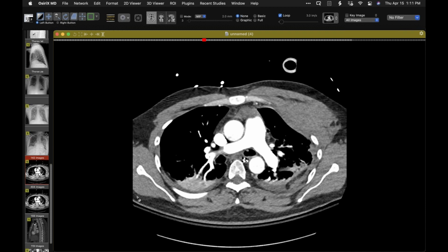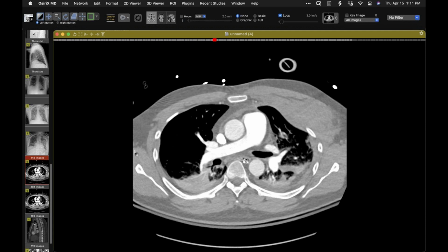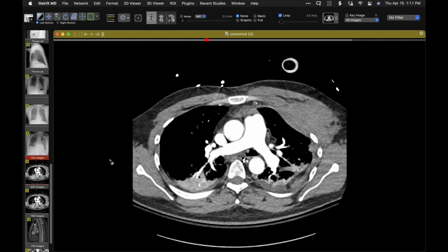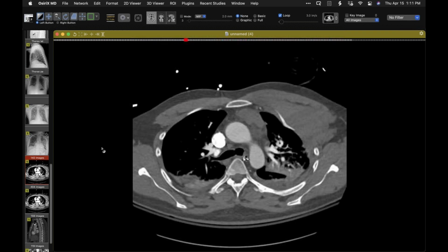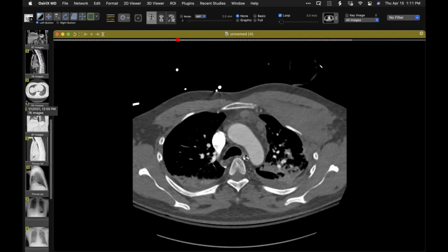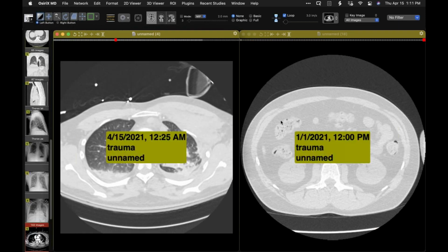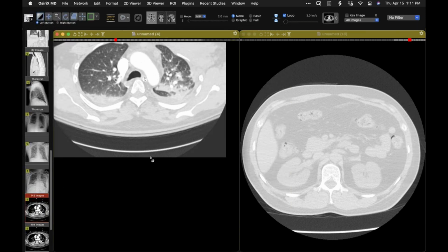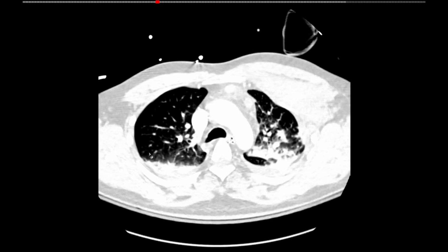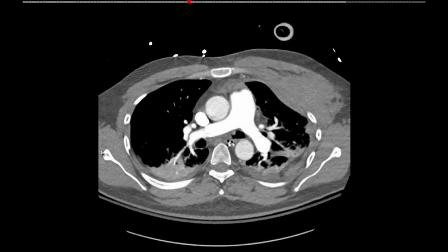They looked kind of, I mean, usually contusions are more amorphous, and yours are very dense. Sure, it's true. So usually, that's presumptive. Yeah, presumptive for sure. I don't know if you can generate enough decelerative force to cause a contusion. I mean, the lowest energy trauma I've seen that caused real contusions was someone getting tackled in football. Okay, but I mean, it's very possible. But that hematoma is impressive, though. Yeah, that's a lot of force that went into this.